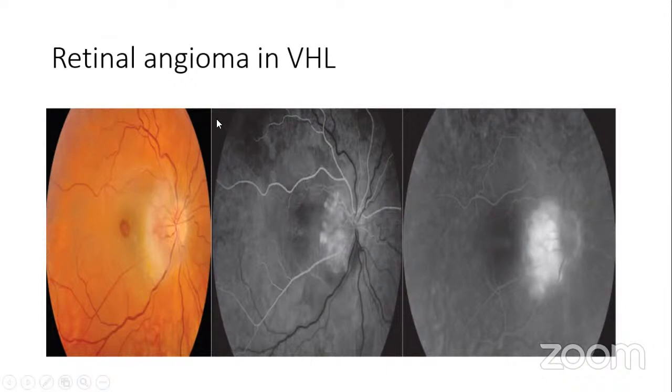If you don't see the time and everything is assumed to be normal, you check the vessels, check choroidal hyperfluorescence, check the arterial, check the venous, and find out what time this is or what time it is meant to be. And then remember the late phase. That's the phase that most persons don't get to look at. In the late phase, the dye should have diluted and should be out. And if it's anywhere, it should be intravascular. If it's outside the vessel, then wherever it is, it's a leakage or a pooling in spaces, leakage into the retinal tissue. Okay.